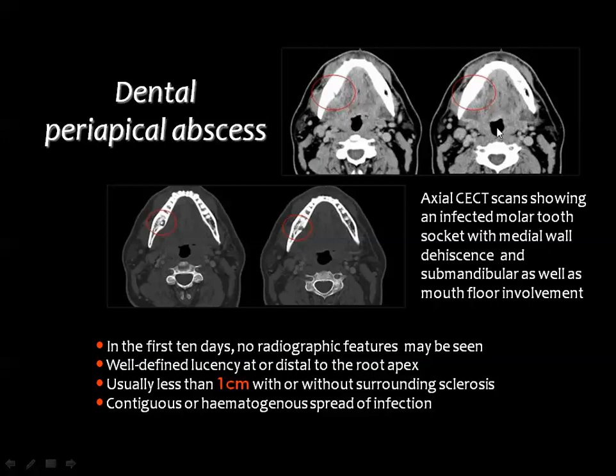And I hope you remember their names from the previous lectures, you know the GG or the genioglossus muscle, and lateral to it the mylohyoid muscle. Between the genioglossus and the mylohyoid there is the sublingual space, and outside the mylohyoid there is the submandibular space.